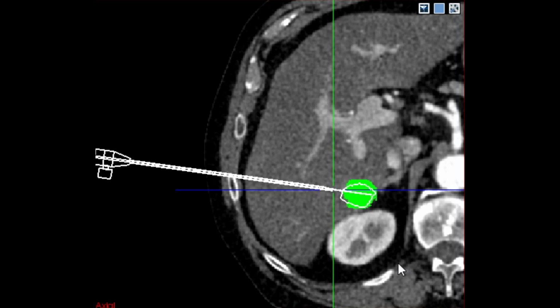Nowadays, modern hardware enables fast simulation of treatment for estimating the outcome of a real intervention. This allows for pre-interventional exploration of the parameter space and for optimized treatment and avoiding tumor recurrence.